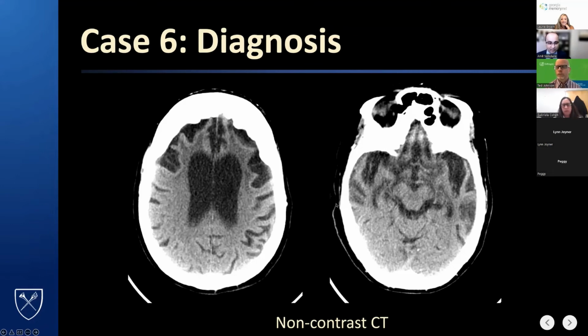This is great. So focal anterior atrophy, frontotemporal dementia. Okay, good. I think everyone's on the right track here. And again, from the imaging standpoint, we can describe where the brain volume loss is most predominant here. And I think this is a pretty striking case.